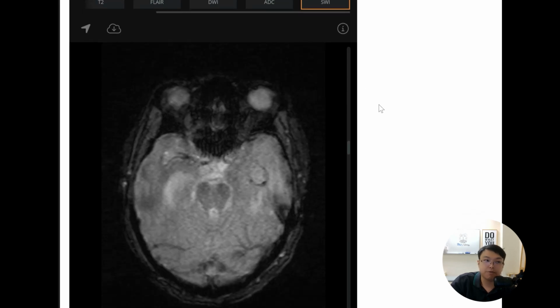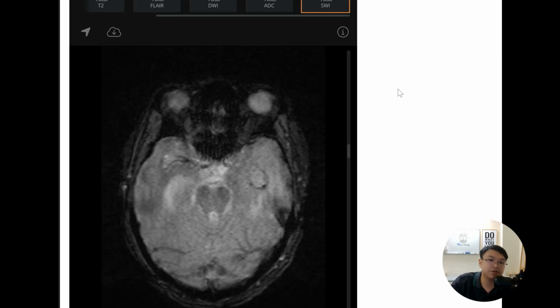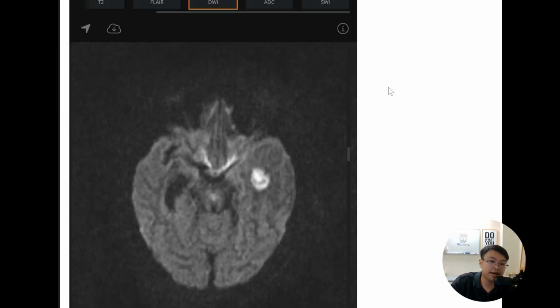So basically, when you see brain abscess, majority of the discussion will lie on, okay, whether it is a cystic metastasis or it is a brain abscess, okay. Both can look like a cystic lesion, ring enhancing, associated with pronounced amount of edema, etc., okay. However, if this is really an abscess, which is proved by the DWI and also ADC map, okay, you need to look for underlying causes.